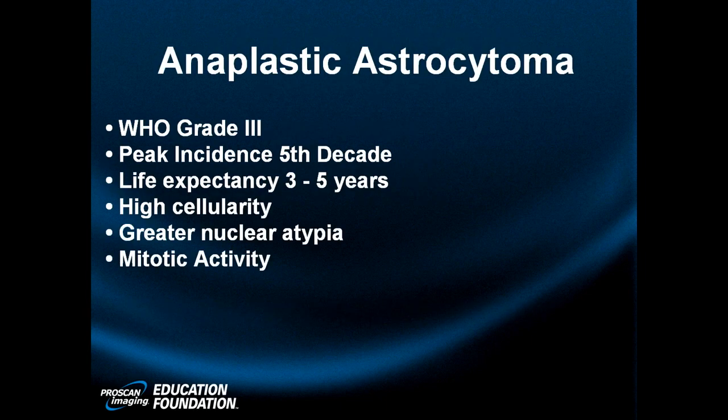Now, we talked about patients that have a pseudo-progression. You radiate them, they necrose in the middle, they expand, they get edema, they look like they're worse, but they're actually better. What's a pseudo-response? A pseudo-response is when you give a patient a medication that obliterates the vascular supply. An example of that would be Avastin. On MRI Online, I have a whole list of every single anti-vascular agent that are used peripherally and in brain tumors. And what it does is it dramatically shrinks the tumor.